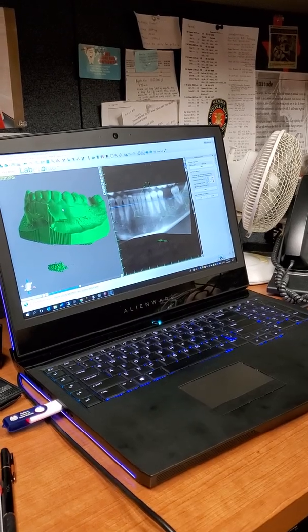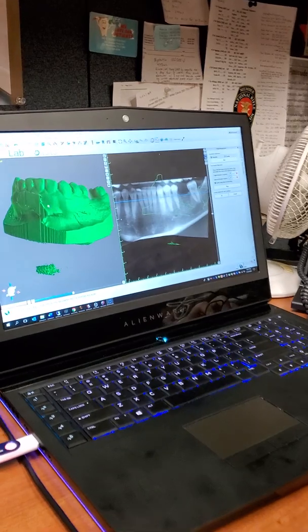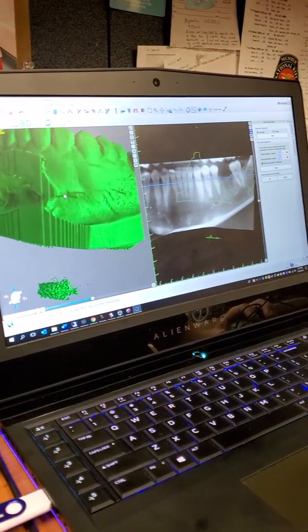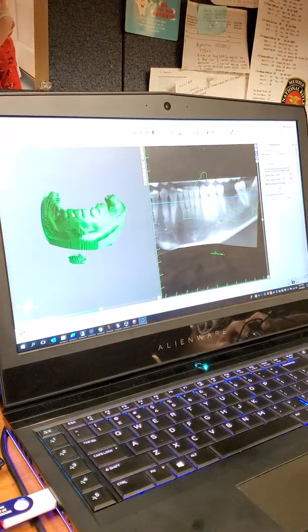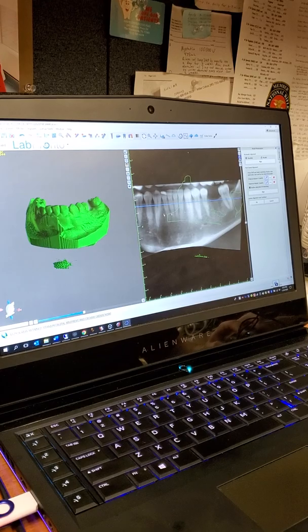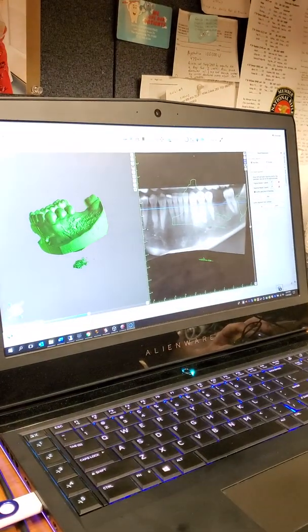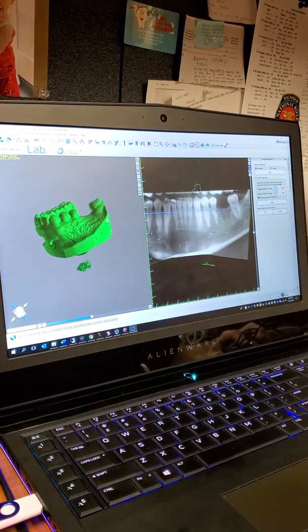Okay, so I've pulled up the Align button after importing the STL model, and I can move forward and back with the scroll button on the mouse. But what I want to do is match my model to this over here. So this green line represents the model as it looks now. Make sure you click the right arch up here. If you click the wrong arch, it comes in upside down.